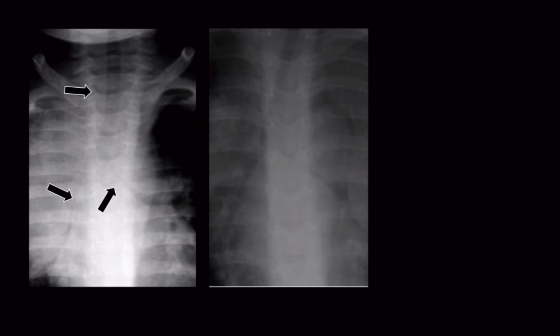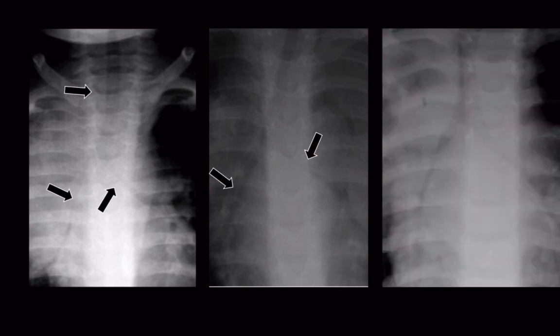Here's another example, a very narrow bronchus intermedius that distends more peripherally, and a very, very narrow left main bronchus that becomes much wider. And a third example, there you go. As you're getting it, probably the bronchus intermedius is the most common site of compression.